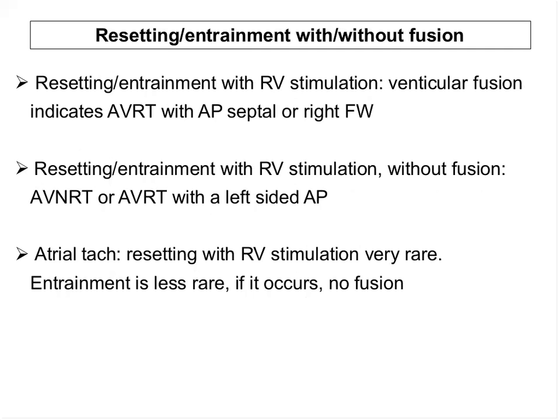We will move on to a different subject, and that is what we call the resetting entrainment response. And the first concept in this regard is to ask ourselves if resetting or entrainment with ventricular pacing occurs with or without fusion of the QRS morphology during pacing.